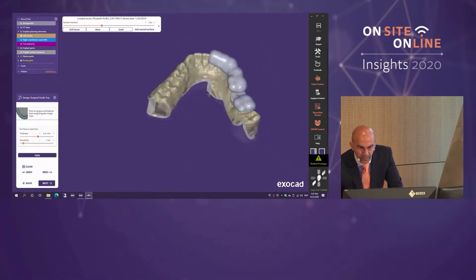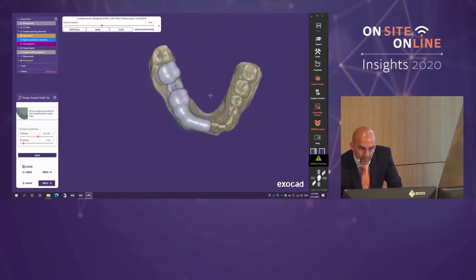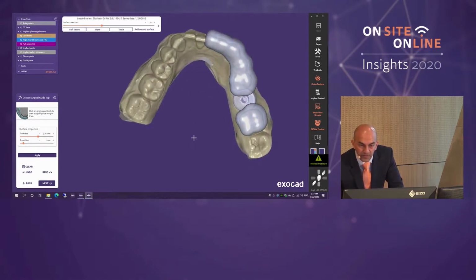Okay, 3D CAD CAM, looking from all different angles. You could even look from underneath. Okay, everyone with me so far? Michael, you're looking confused. Is it a difficult question that came?